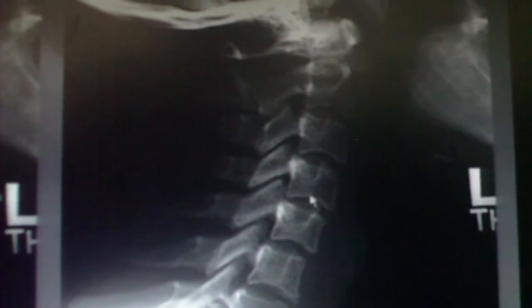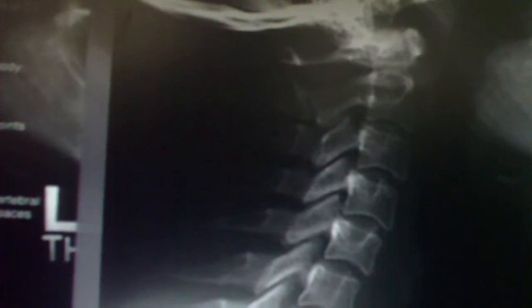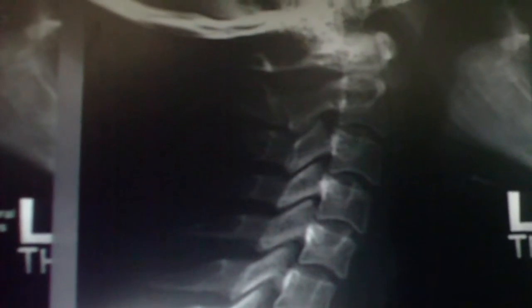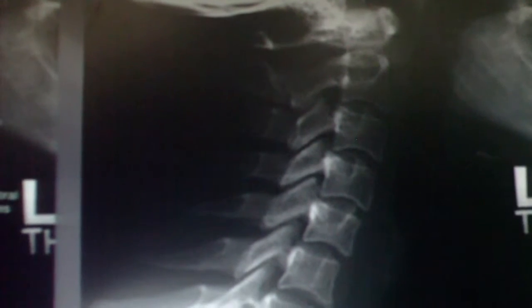Okay, so disc space, these are called what? These invaginations, we'll talk about them more again in the lumbar spine. Notochordal impressions, or if you want to call it invaginations. I've heard it called persistency, but invaginations or impressions make more sense. Or nuclear, right, like nucleus pulposus. And the nucleus pulposus really is notochordal remnant, right? So you either call it nuclear or notochordal impressions or invaginations.